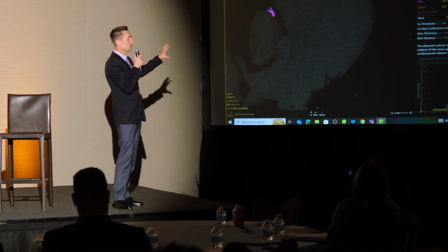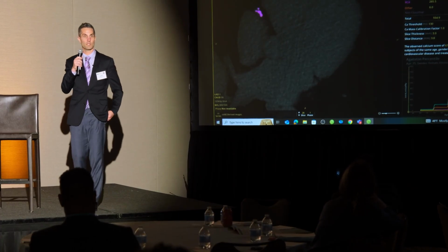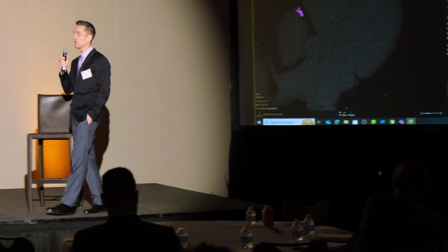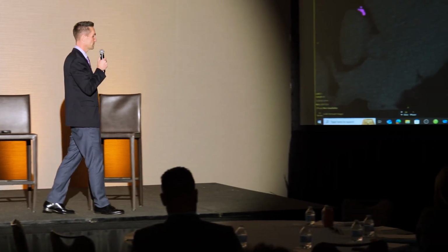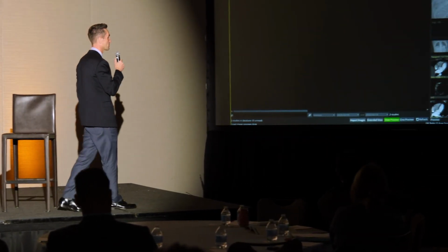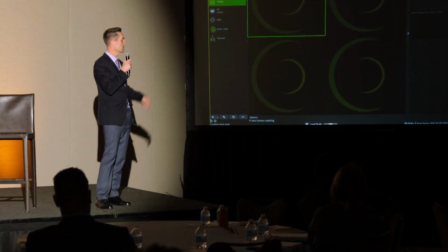So it does all of that calcium scoring, and it does the post-processing for the coronaries, but we also have everything in a complete package where we can do all of the cardiac CT work, besides even just the coronaries. We can do structural work. So can we see an example of the TAVR? A lot of people ask us about the TAVR is a 2-click application.